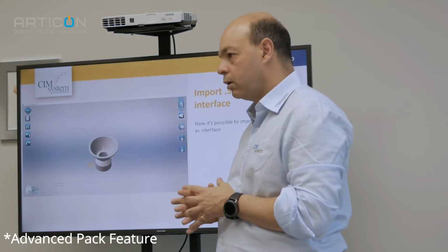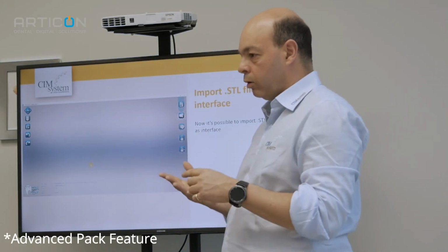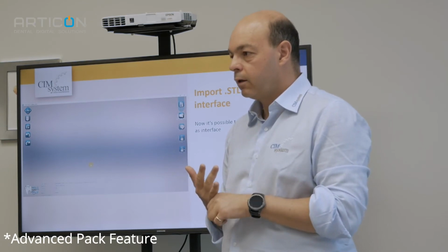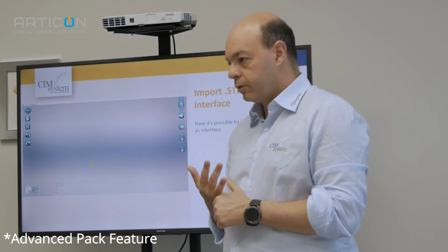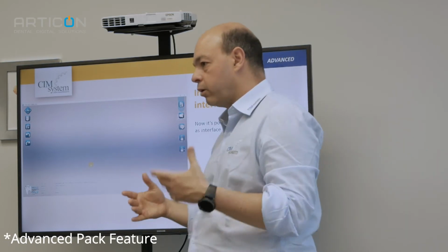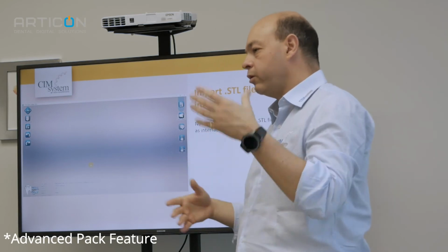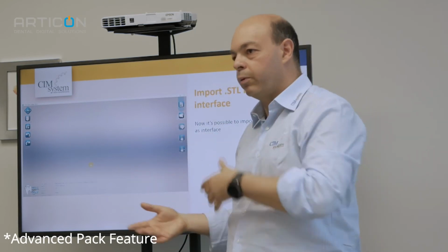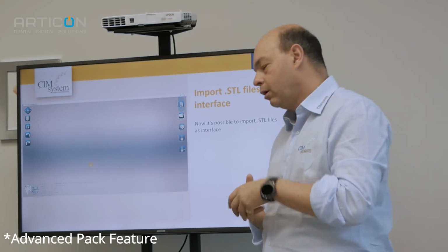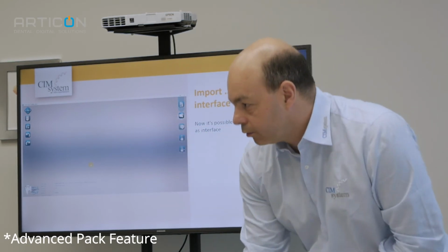What's the extension of those files? I have STL. You have the STL, binary STL, there's a lot of STLs. Binary STL? Yes. Binary STL. Okay. You create it with another software. Yeah. You import in. Now it's more easy. Before you needed to open some 3D, open TXT file. It's very complicated, but now the wizard is very easy.